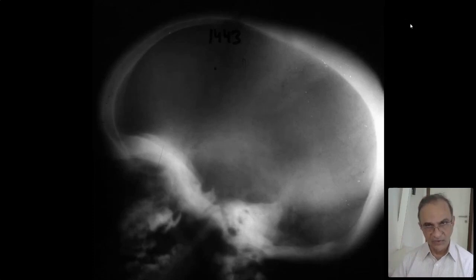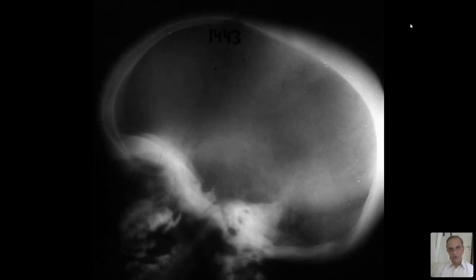By and large, in most skeletal dysplasias, you will find that the increased bone density in the skull is at the skull base, right? And again, this is a pattern which is related to decreased osteoclastic activity. So this is increased bone density. So we have the differential diagnosis of common ones. What I'm going through now is just the common ones, which will constitute a vast majority of skeletal dysplasias that an average radiologist would see. So if you have increased bone density on this initial skeletal survey, you think of 3 conditions, right?